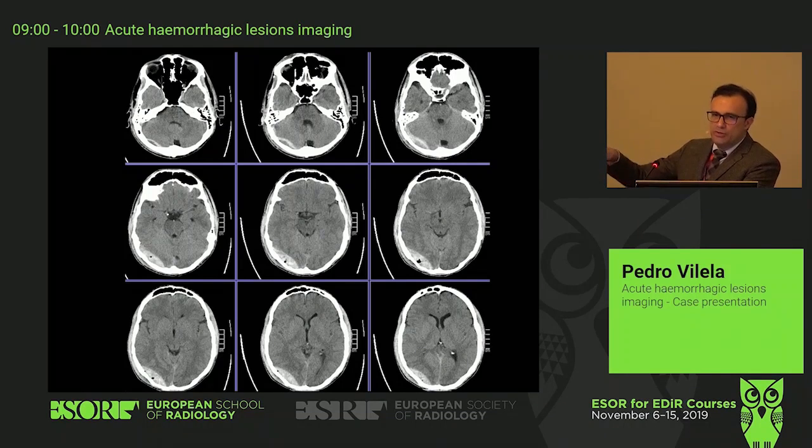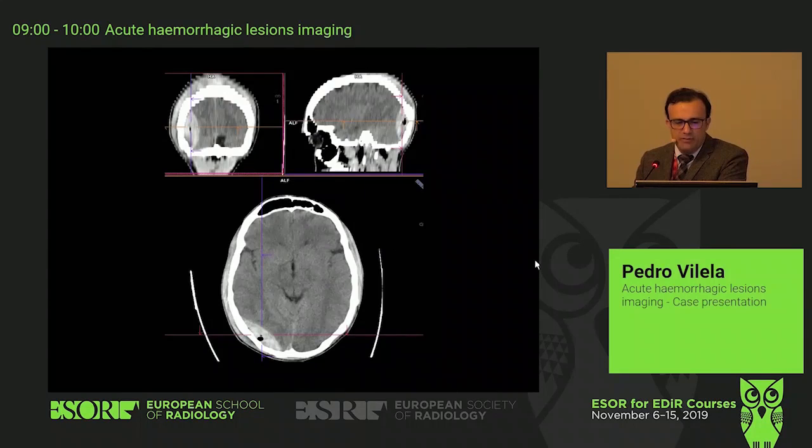Because the subdural will continue to the tentorium and will not pass from the infratentorial to the supratentorial or vice versa. The other thing that was pointed out is that this is caused mostly from a rupture of a dural artery at the surface, and we have signs that this is an acute hemorrhage. We have blood that is not yet hyperdense, hyperattenuating, so this patient is in active bleeding. We need to be very careful with this patient. This is like what we have in real life.